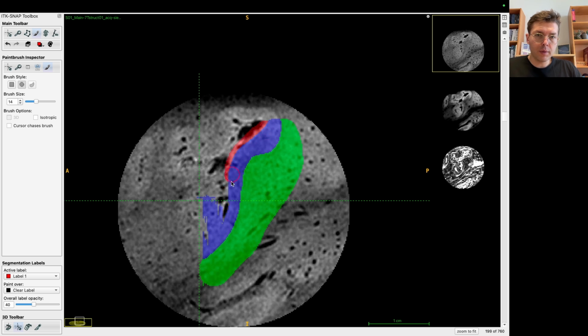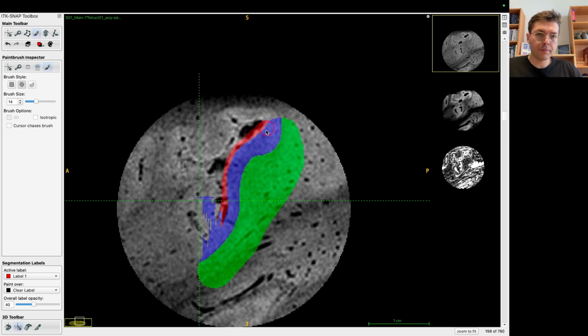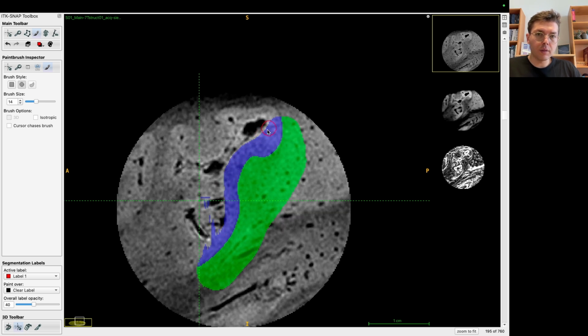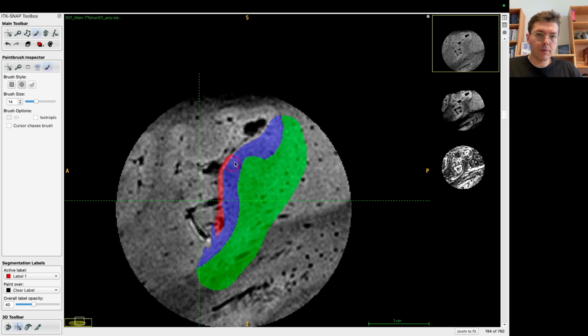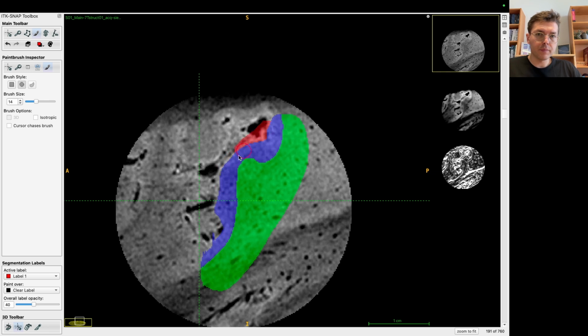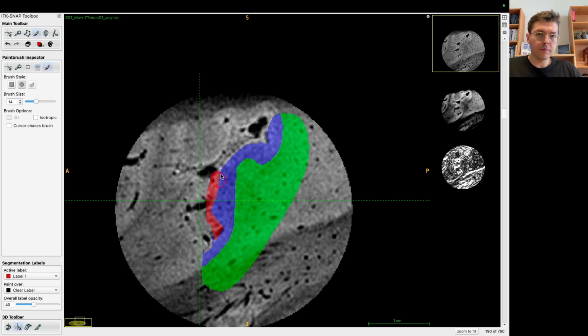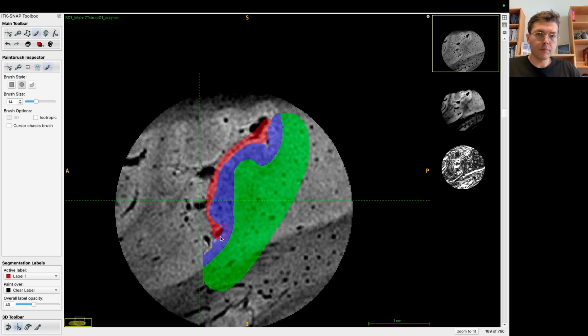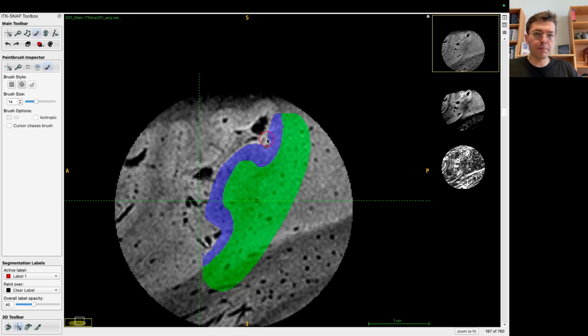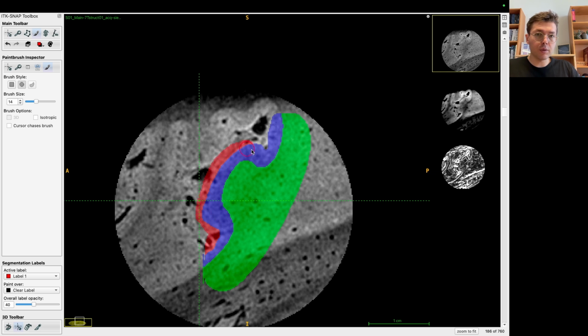Okay, now I'm putting a boundary because this is needed for later computing the cortical layers. An outer gray matter boundary that dictates between which boundaries the layers will be computed. And you see that I am leaving this part open on purpose because there is not the outer gray matter. I'm just putting the outer gray matter shell where the CSF boundary should be.